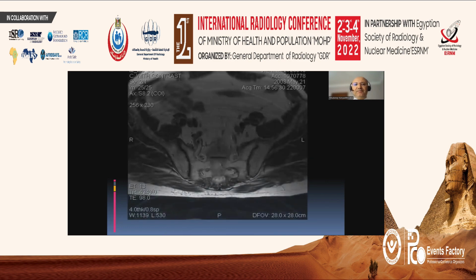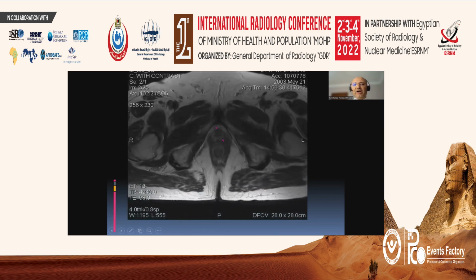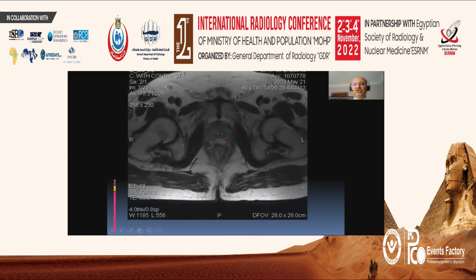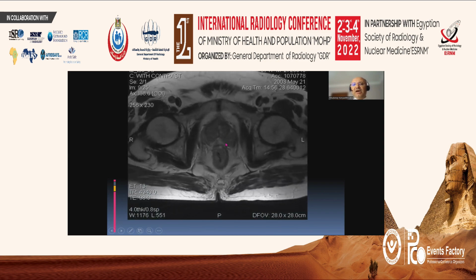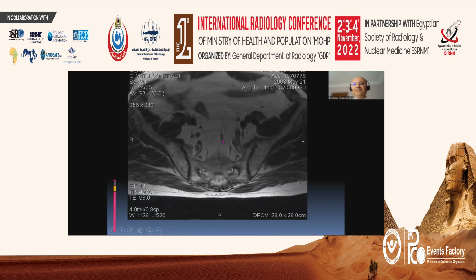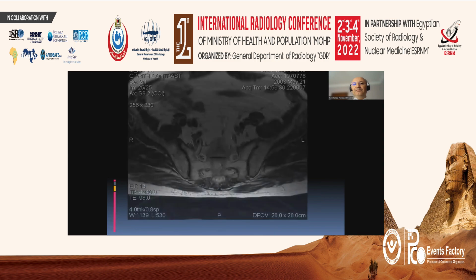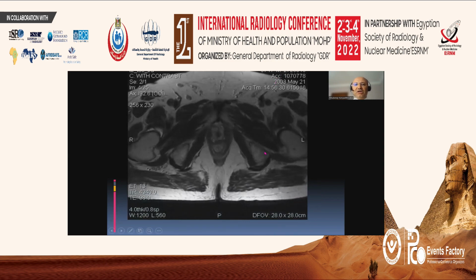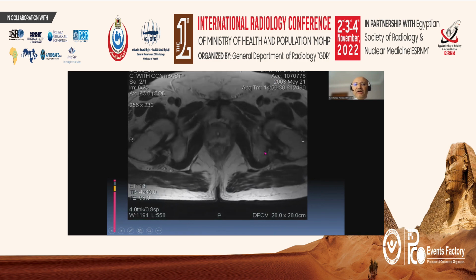future. I want to show you this prostate MRI, and you can see that this is the apex, and the prostate is coming up, and you can see the tumor right there. It's invading the left seminal vesicle. So I'm going to run it again, and this time, just take a look at the date of the exam. It's 2003. We've been doing prostate MRI more than 20 years.